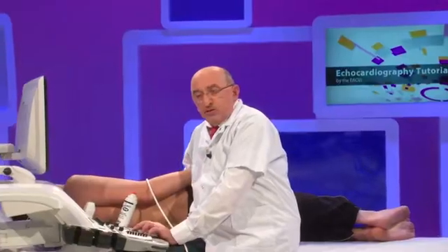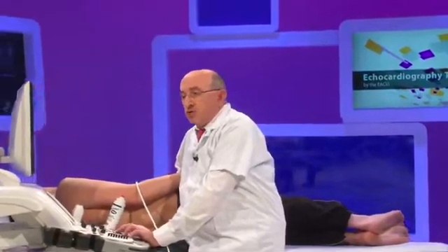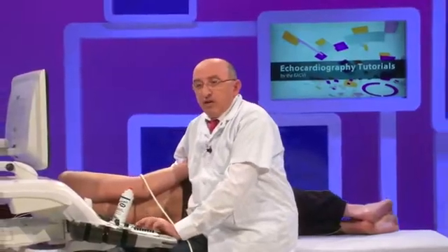So the key message from this case is that with transthoracic echocardiography we can get several very important pieces of information concerning the assessment of infective endocarditis. We can have information about the diagnosis, but probably the most important is to get information about prognosis. And if we go now to the indications for surgery, we have to keep in mind that the three main indications for surgery are heart failure, embolic events, and presence of perivalvular lesions.